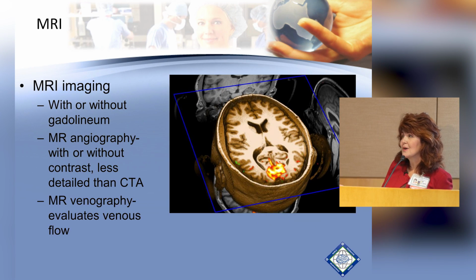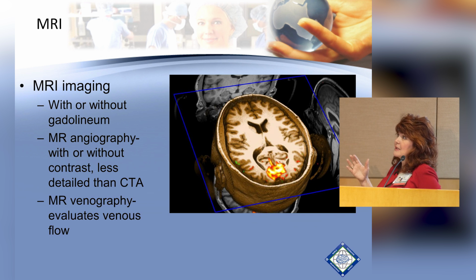So before we had MR, CT was fabulous, and now that we have MRI imaging, there's such detail that it provides. Most people really, really like MR images for things like tumors. There are things that CT is great for. If you have a bleed in your head, fabulous. CT is really, really good. If you have a tumor, I'd much rather have an MRI.